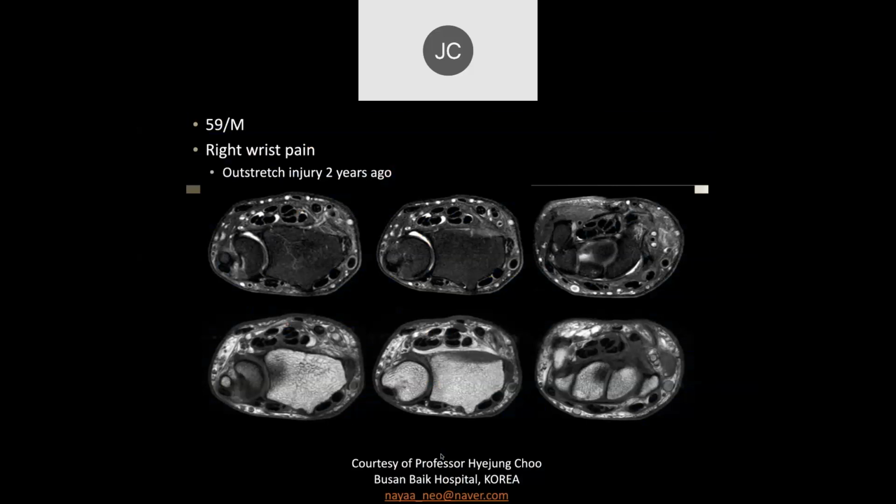So, Taysom, what do you think of this case?